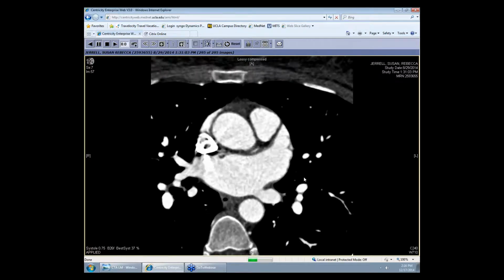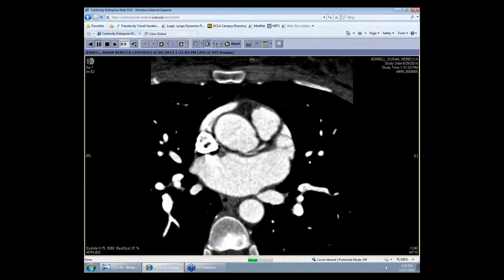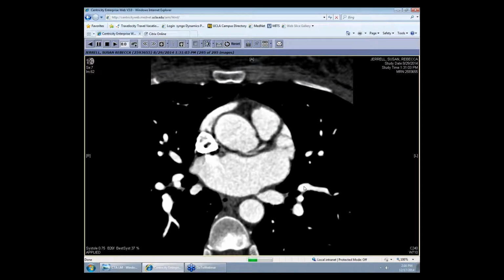Yeah. It could be intramural, but a very short segment of intramural. Could you ever do a cross-section of this just short after the ostium? Could we ever... I didn't follow that. Could you ever do what? It would be ideal when you have these conditions to have a cross-section of the proximal left main, the first 2-3 millimeters, in a cross-section at 90 degrees from this plane.